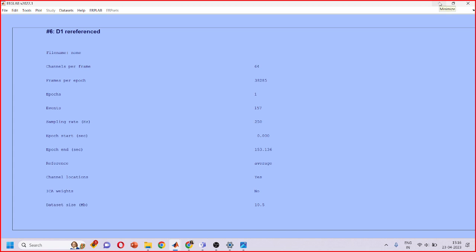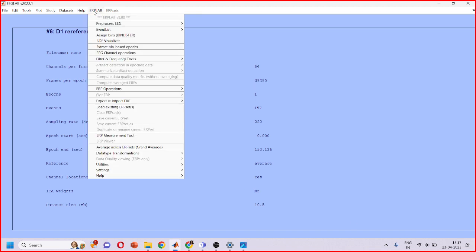And I'm telling you this difference because when I used to work with Brain Vision Analyzer, that gives you an IIR, and that gives you the power to change the order of the phase delay that you will be using. So this is one thing to remember whenever you're using a filter, in whatever software and whatever coding platform you're using, you have to take note of that particular thing, right? So I'll quickly look at the time. Okay, it's not that much, right? So we'll jump on to ERPLab now.